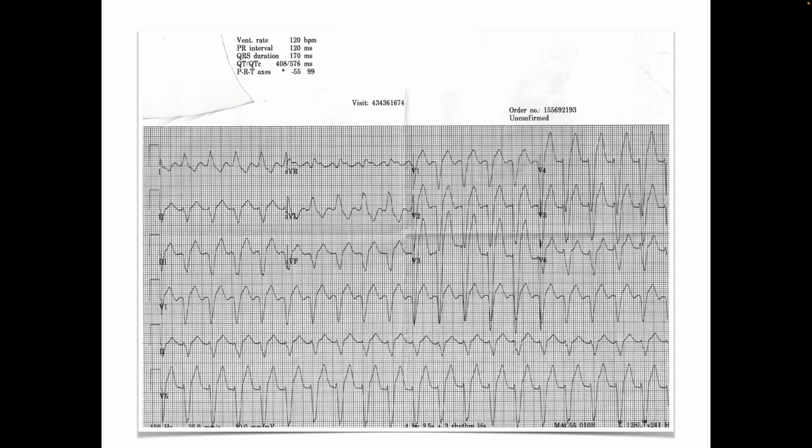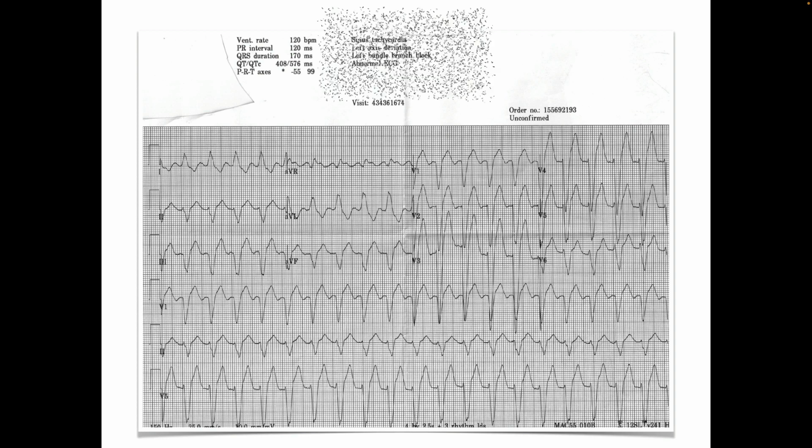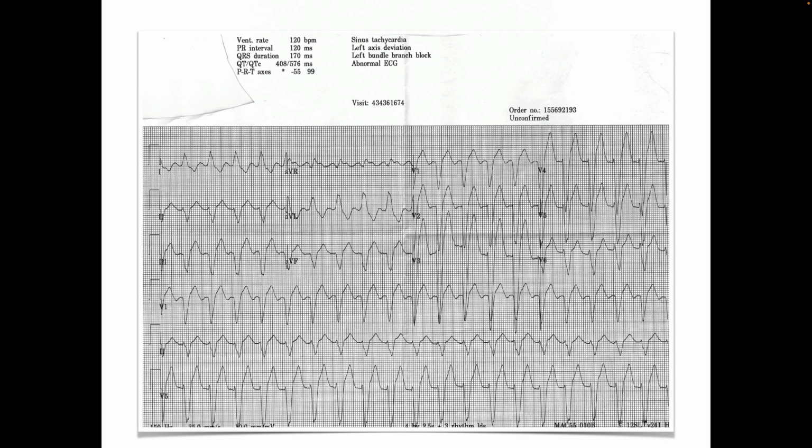Is that VTAC? Well, you're definitely smarter than the monitor, okay? Because look what it says. It says left bundle branch block, okay? Now, why is it not a left bundle branch block? Yeah, it's not supraventricular, right?